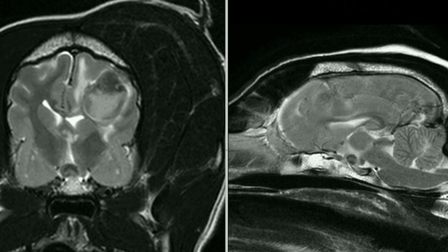When we have intracranial pathology, it's quite important that we look for evidence of increased intracranial pressure and secondary effects which may be amenable to treatment. In this case, we can see there's quite extensive perilesional T2 hyperintensity, which is within the white matter and consistent with vasogenic edema. The combination of edema and the mass itself is causing this quite large midline shift to the right, so subfalcine herniation, and compression of the adjacent parenchyma.